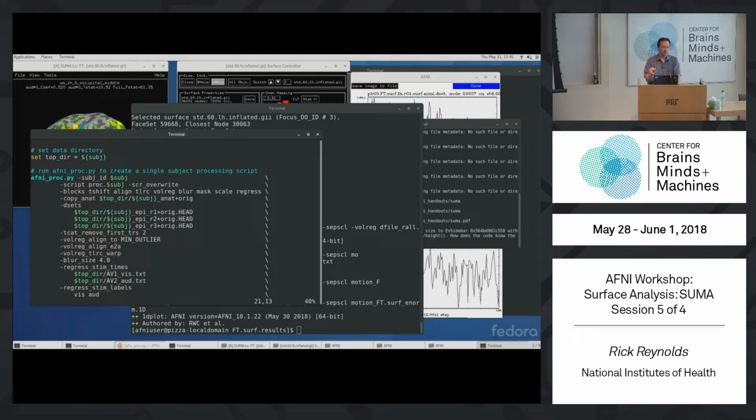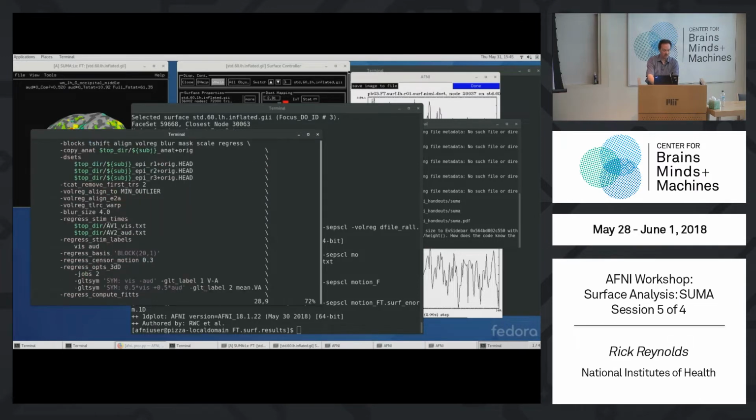And in order to compare these, remember we aligned our surface data with the current T1, right? So what if we did our EPI analysis without a tlrc block? Now it's the same analysis, but we're aligning to the current T1. That would put these volumetric results in alignment with our other results. So let's do that. Do we have any tlrc stuff? So let's get rid of that.